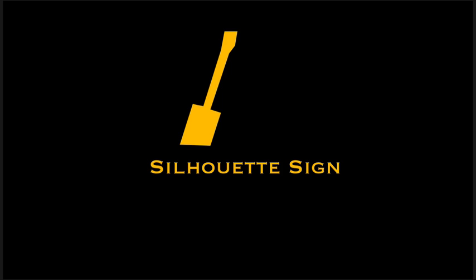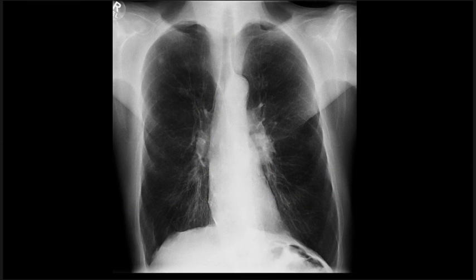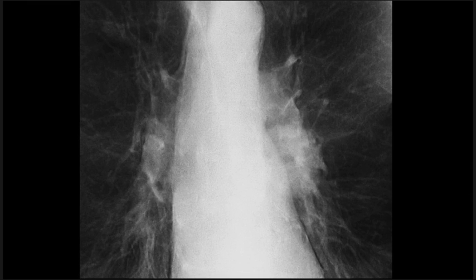So we touched on this briefly in the last case, that there's more to the silhouette sign than just finding stuff. It's also useful for localizing. So let's look at an additional application here, not necessarily with the lungs, but in the hilum. So frontal radiograph, and we'll zoom up on the hilum here, and you may see that in the left hilar region there is a round mass.